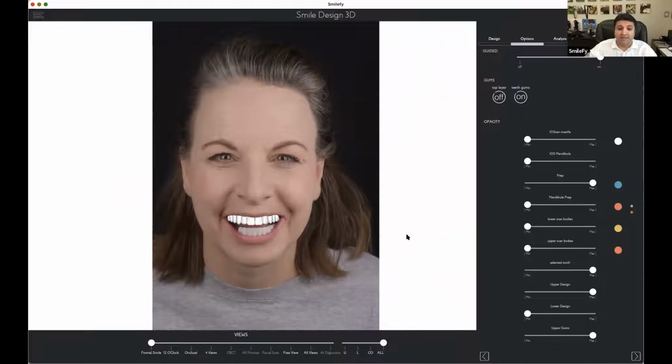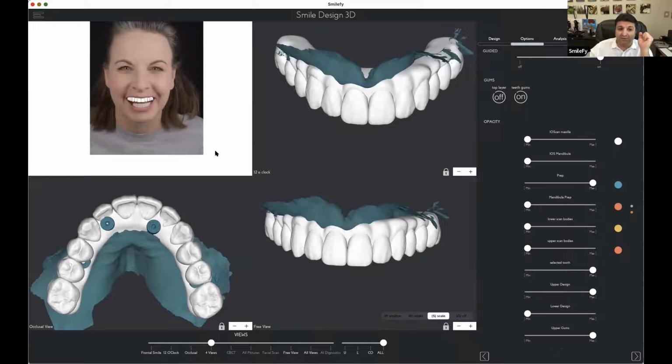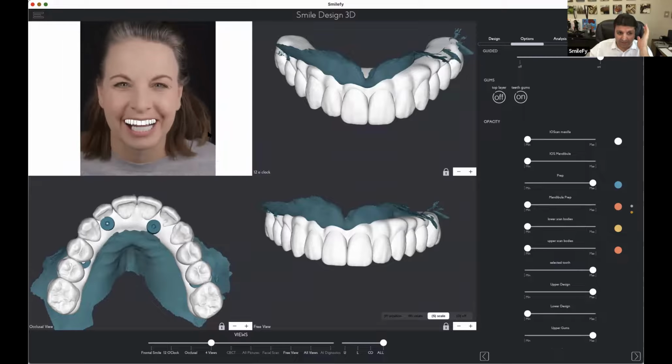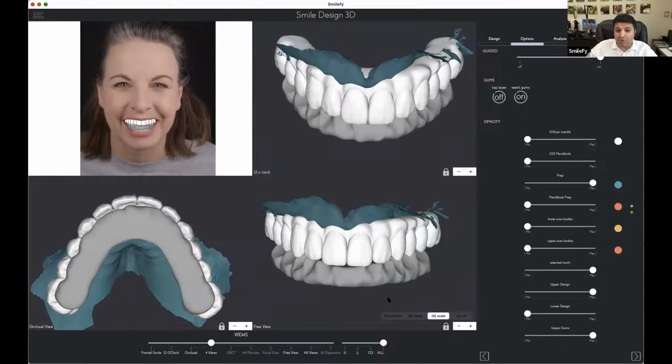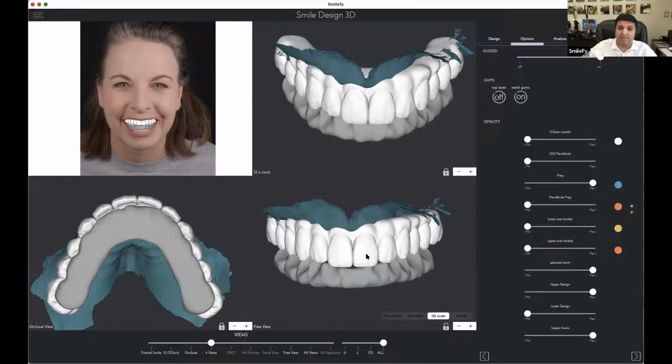Of course, I know that to be able to create something really special, we are gonna work also and create colors on the teeth, light reflection and colors. Now everything is white and gray because, again, that's a prototype. It's the way we develop things and we create everything together.